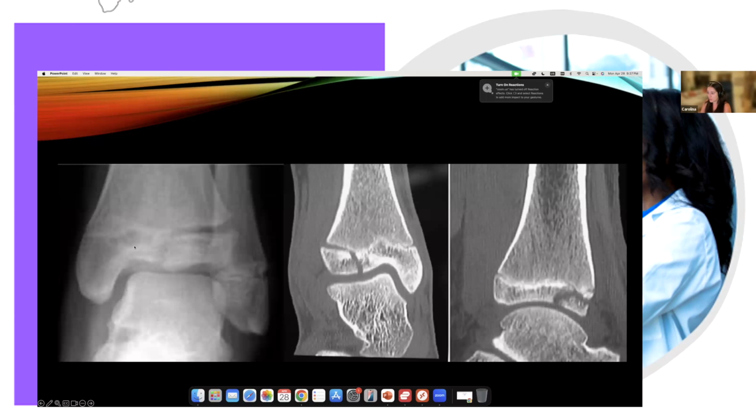So they're old enough so that this part of the physis is already closed. However, this one remains open, and at the time of trauma, there is a fracture through the still open more lateral physis and through the epiphysis. So the name of this fracture is Tillaux fracture.